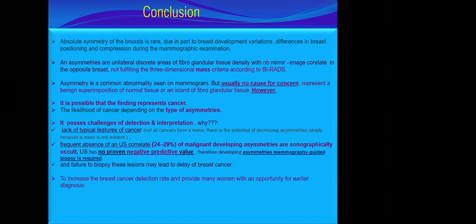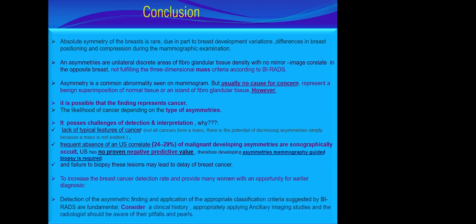To increase the breast cancer detection rate and provide many women with the opportunity of early detection of breast cancer, we need to follow the appropriate classification criteria suggested by BI-RADS, with detection of asymmetric findings and application of these lexicons.